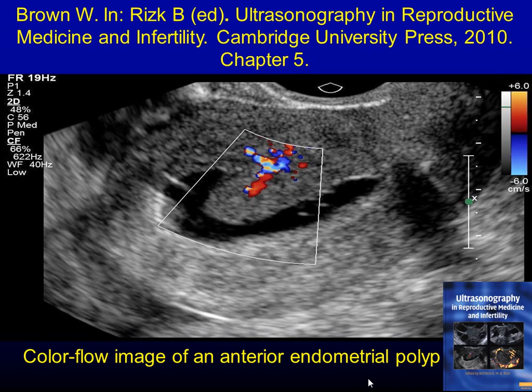So this patient presents with abnormal bleeding. You do ultrasound, all you can see is thickened endometrium. That's the first report that comes, a thickened endometrium. So if the patient has a clinical problem and you find a thickened endometrium, then polyps are one of the commonest things. Again, could be polyps, fibroids, or scar tissue.